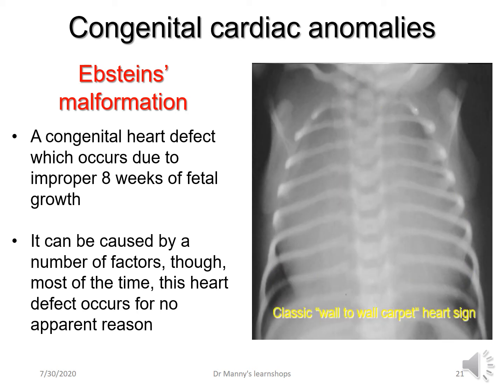It also has what's referred to as the classic wall-to-wall carpet heart sign, because again, the heart encompasses most of the chest. The heart is huge. It goes from one end of the right side of the chest to the other side.